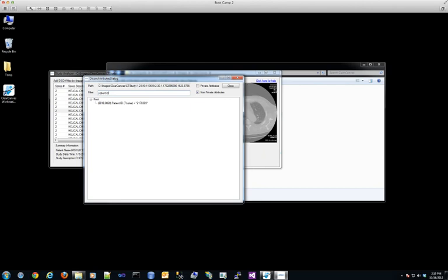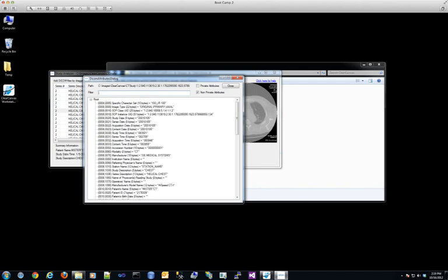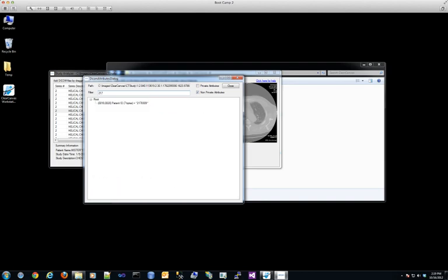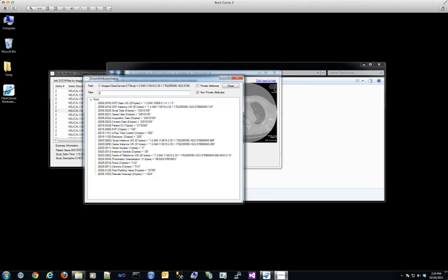Likewise, not only does it search on the DICOM tag, but it can also search on the value of the attributes themselves. In this case, the patient ID's actual value is 2178309. So I'm going to delete my filter and start typing in the patient ID. So 217, you'll notice that it scanned through that list and found just that attribute. And if I back up to fewer, if I just do 2, you can see there's a number of values that have the number 2 in them, and it shows all of them.